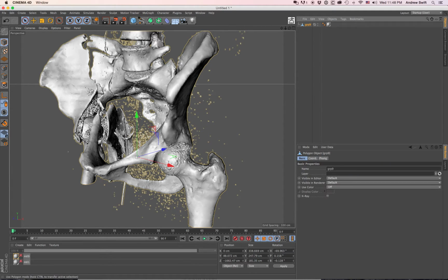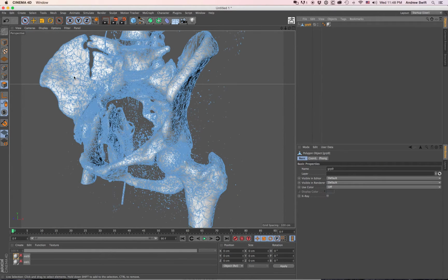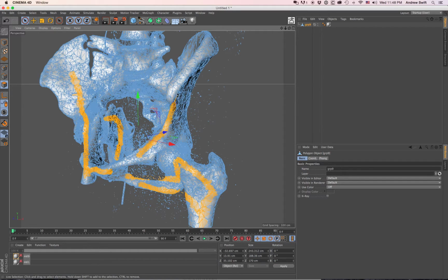And so what we're going to do, I don't know how to do this any other way. So I'm going to select polygons on all the structures I know I want. It doesn't have to be a lot, right? And like I said, this is going to leave some holes. This isn't going to be perfect, but again, for the purpose of demonstration. All right, so I've selected something like that.